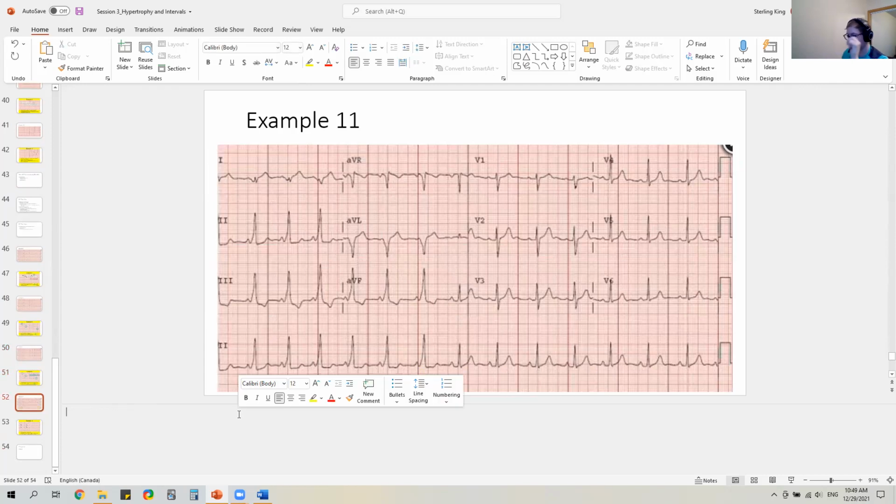Right, last example. I'll give you a couple seconds to pause the video and get started, and then I'll start. Right, so let's do this. So 1, 2, we'll add this one. 1, 2, 3, 4, 5. 14, so 14 on. So rate 84.